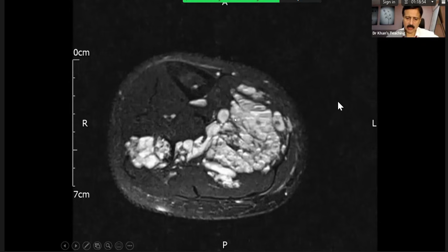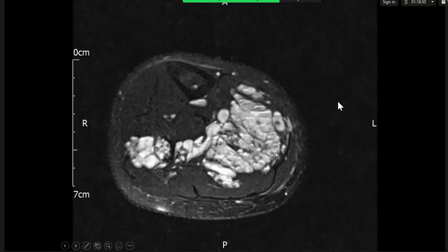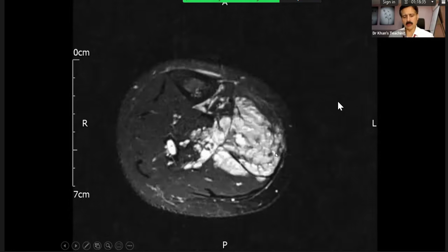Anything comes to your mind? What is happening in this region? Given that it's serpiginous, there were what I thought were phleboliths and in continuation of the vessels. I think this may represent a vascular malformation. Okay, please continue. There are more sequences.